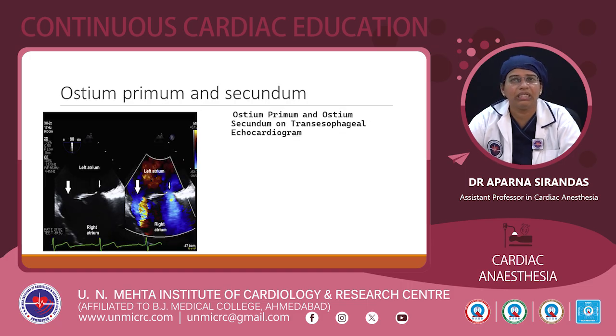And in this figure you can see ostium primum and ostium secundum on transesophageal echocardiography. You can see from this one left atrium and right atrium, one superior and inferior figure, showing one is ostium primum and one is ostium secundum.